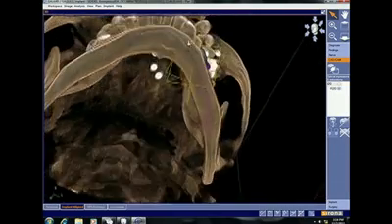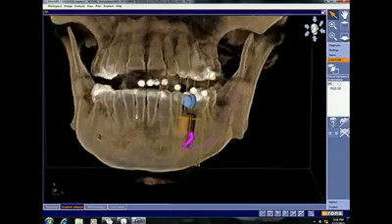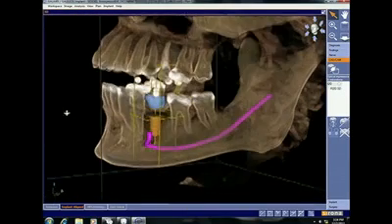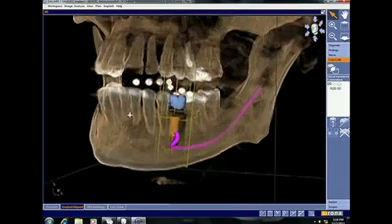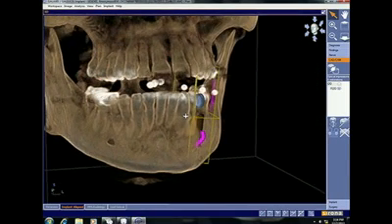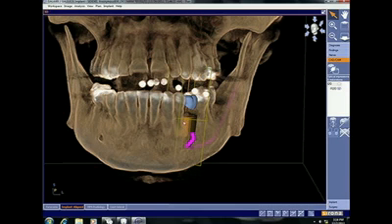And if you remember, the reference body was shaped like a T-shaped bar. That reference body contains these glass soda beads. And these radiographic markers are important because it helps the software understand the relative location of the planned implant relative to the block that we're about to mill. In order for us to make sense of everything, we have to first identify this reference body within the software.